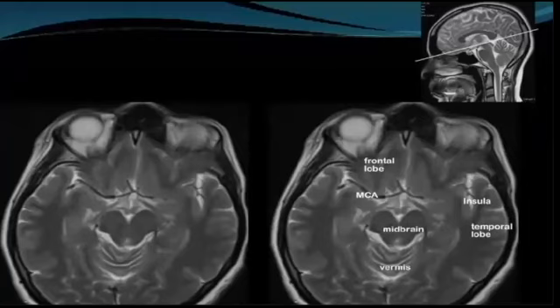Okay, so moving forward, we're just going to always take a look at the line here. It's going to tell us which structures we are looking at. So here we're starting from the most inferior and then we're going up. Now, the main objective here is just for us to identify the anatomy. Because I know a lot of you are going to get this confused, especially if they give you any arrows on the exam. Now, the part that is most peripheral here, so please follow the cursor carefully.